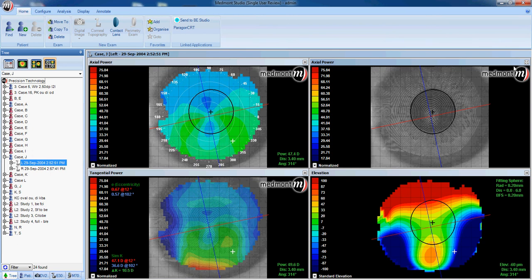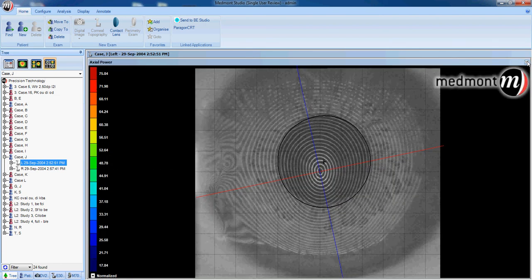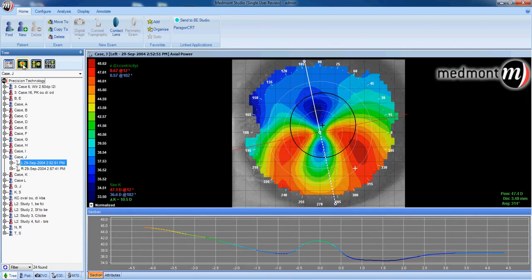which allows you to view the map a number of different ways. This function may be most valuable in looking at the photokeratoscope image, looking for the quality of the placido reflection, eyelash shadows, measuring visible iris diameter, pupil size, these type of options. Let's click back on the main image option and review some of the other analysis options available to us.